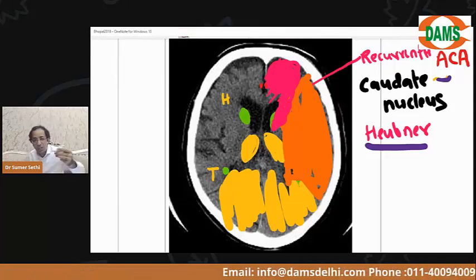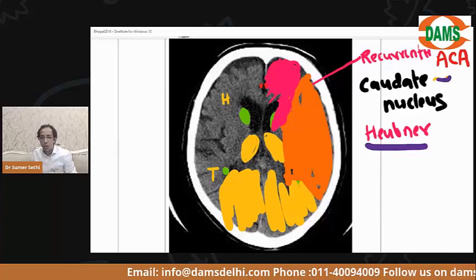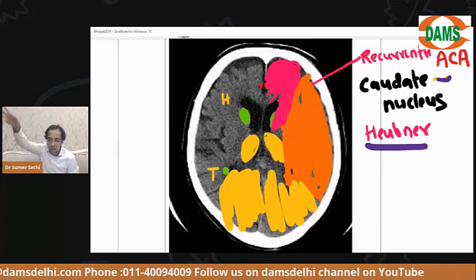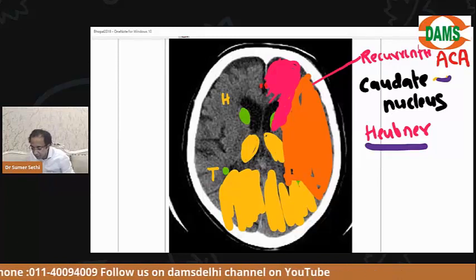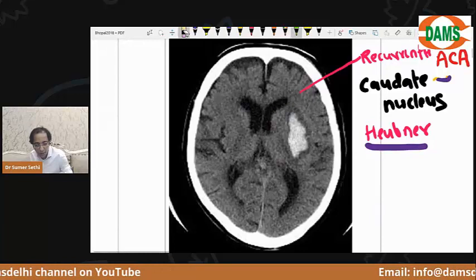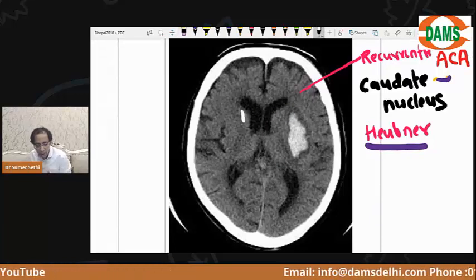Okay, PCA is supplying the occipital lobe and the thalamus and the midbrain, and rest of it is the MCA territory. ऐसे होता है ना जब हम रेडियोलॉजी में, you must have seen ना, hospital you come and show me a CT, I say this is a MCA territory infarct, ACA, PCA. कैसे पता चलेगा ना बेटा? This is how we think of it. Okay, now let's see an answer बेटा. I will give you some numbers and you have to answer बेटा. Name the area marked as number 1.